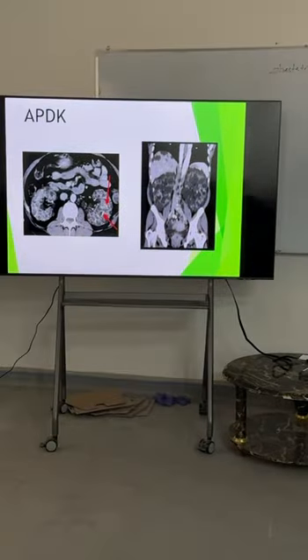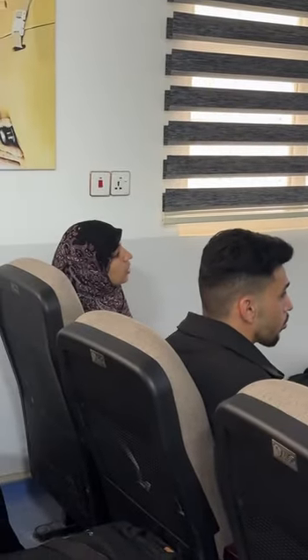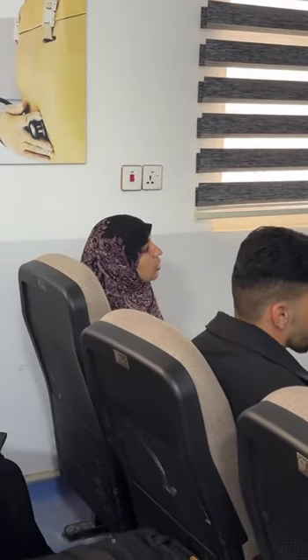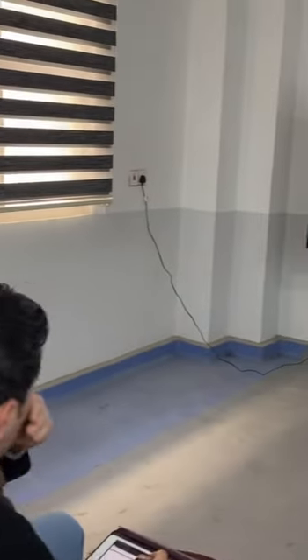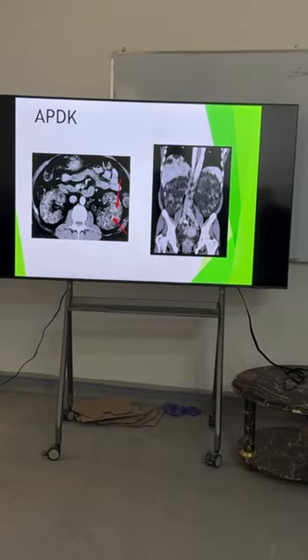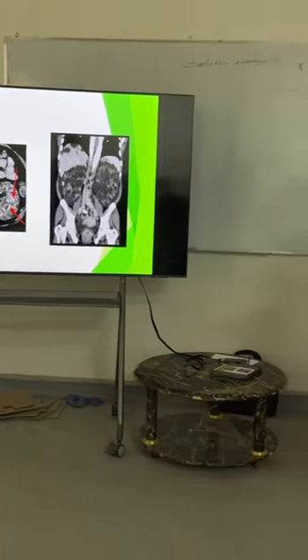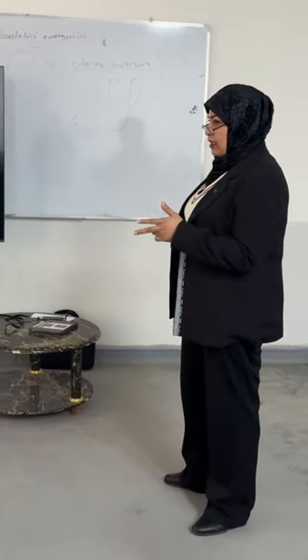Go explain this abdominal CT scan. Yes. Axial section. Large kidneys, both in axial and coronal sections. Bilateral polycystic lesion. Not polycystic, do not use the name of the lesion. Just say multiple bilateral small cystic lesions. This is the description, not the diagnosis. Yes, continue.